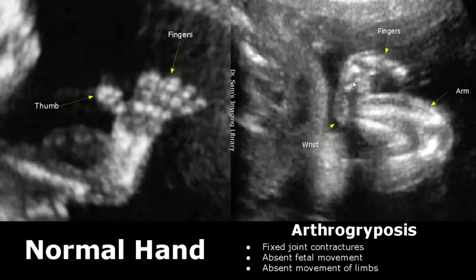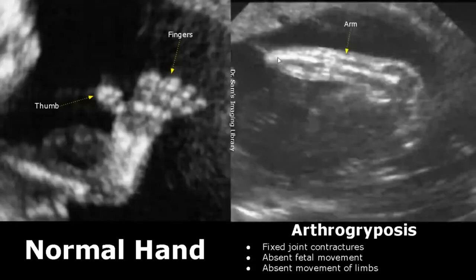We will not find movement of the limbs. You will see fixed joints and stiff arms and legs, which will not change their position throughout the pregnancy. This is an image of the arm. It has remained in a fixed position throughout the pregnancy.